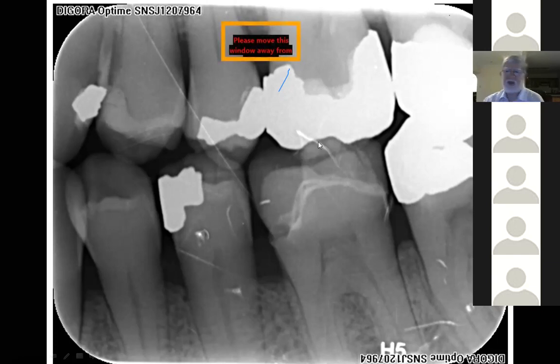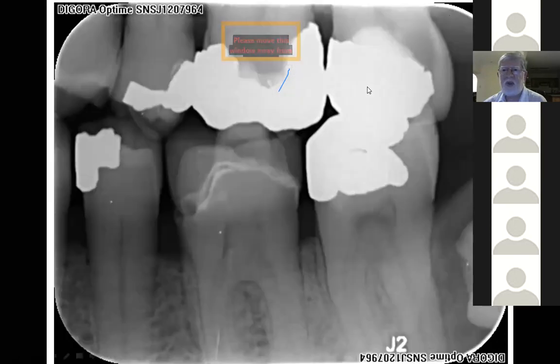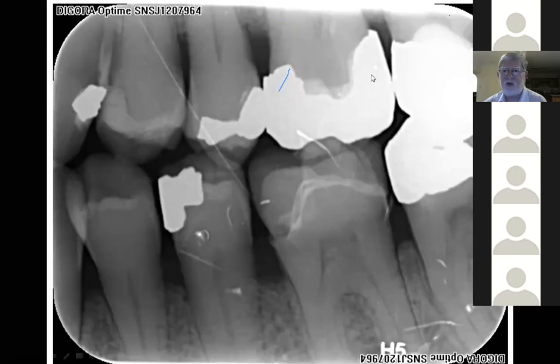The other thing is sometimes when the span of the arch from mesial through to distal is large and you're not quite capturing everything. We're just seeing at the picture here, this could be decay. So let's see. We take this X-ray, and I've gone further back. I'm not going back far enough on the first one, I'm not seeing enough of the 7.